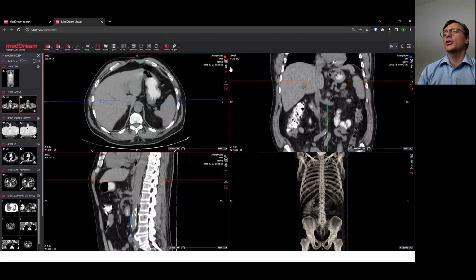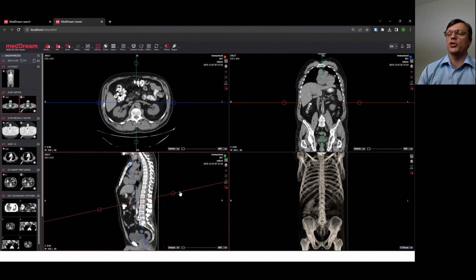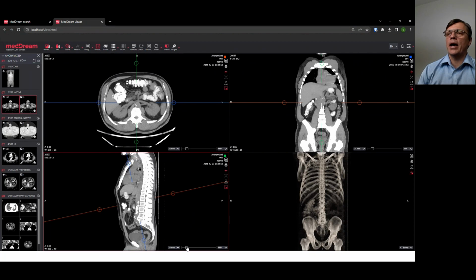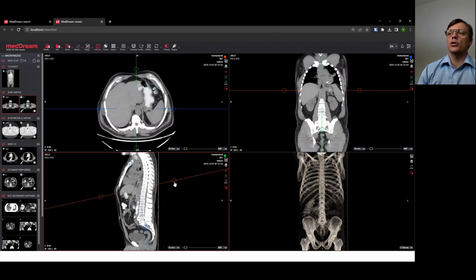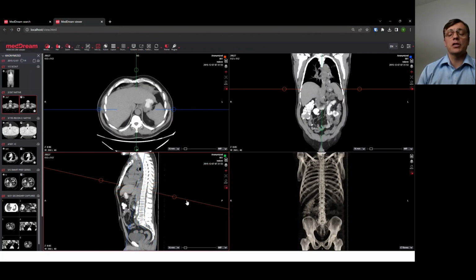I can easily change also the layouts which I want to use. So this is definitely a totally different approach. Plus I can create a capture of these images and also apply the MIP very fast. This is a totally different speed and performance which we achieve now, which was unachievable with the oblique functionality we had.